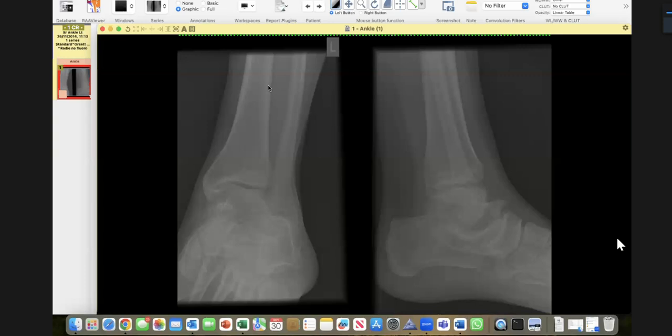Can you hear me? Okay, so now this is a 32-year-old male with foot pain. Okay, sir. I'm provided with the frontal and lateral projection of a 30-year-old male patient who has presented with foot pain. Sir, can I window this? Yeah.